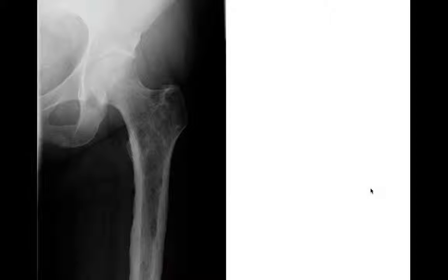All right, radiograph of the femur. Here we have all these lytic areas in the proximal femur. So this is an infiltrating lesion. I would call this a permeative lesion, a diffusely permeated lesion of the proximal femur. So remember, we're going to think of nasty things in this case. So mets and myeloma, I certainly think, are going to be the top two.